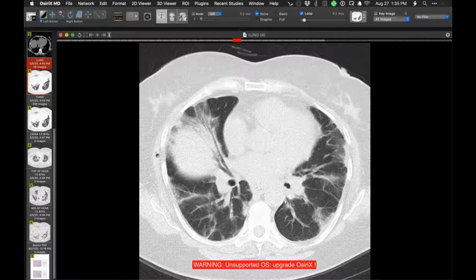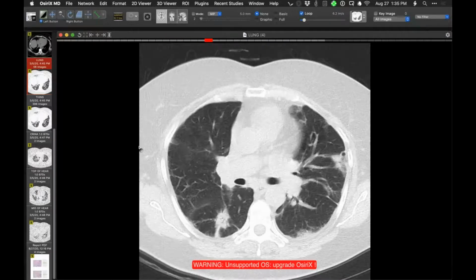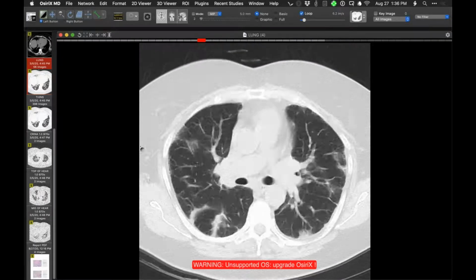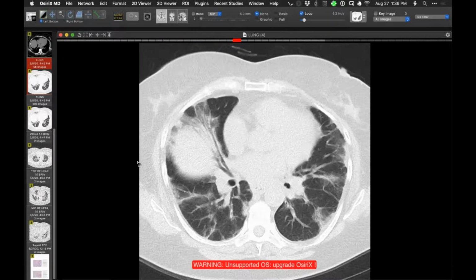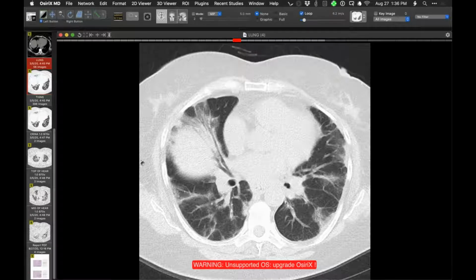So Howard, before you go ahead, to me, I would look at this and say this is like an organizing pneumonia pattern of injury. It's pretty typical. Yeah, definitely. Multifocal, multilobar, variably sized opacities in the lungs. But I'll be curious to see how helpful the biopsy is, because in our experience, it just shows acute lung injury and the differential is so broad. Occasionally, you might see something that points you toward a connective tissue disease, but it's usually not enough to make the diagnosis.